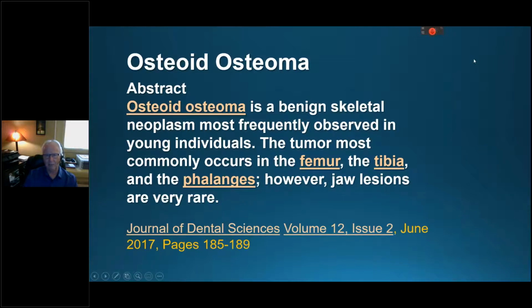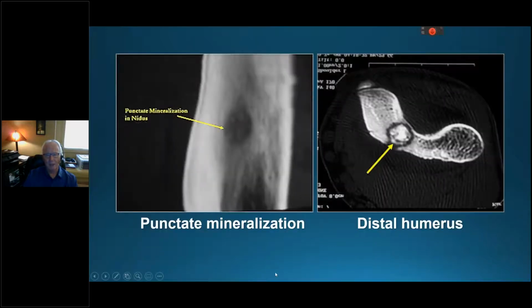It's kind of like tooth pain, but you won't find any tooth-like findings. You won't find any pulpal change, periapical change, or periodontal things to start you down that path for a diagnosis. But if they have dull achy pain and one of the lesions I'm about to show you, you have to consider osteoid osteoma. Now, these aren't in the jaws, obviously, but I want to show you something that holds up no matter where the lesion is located.